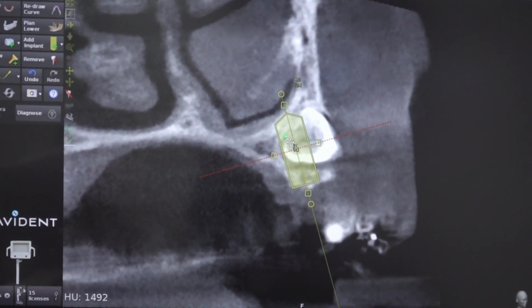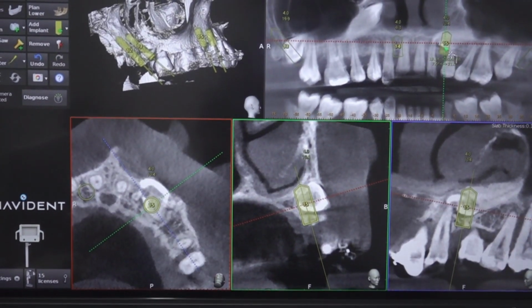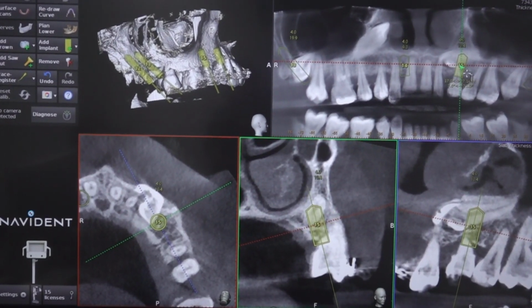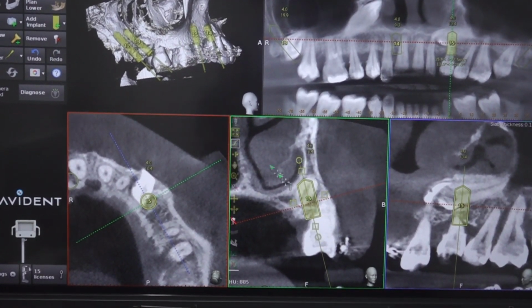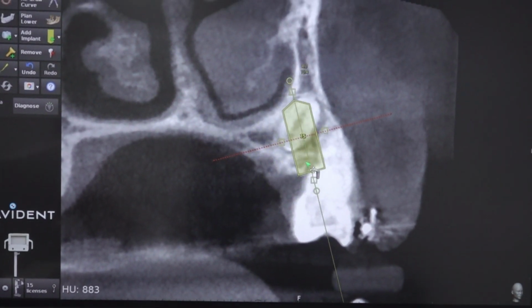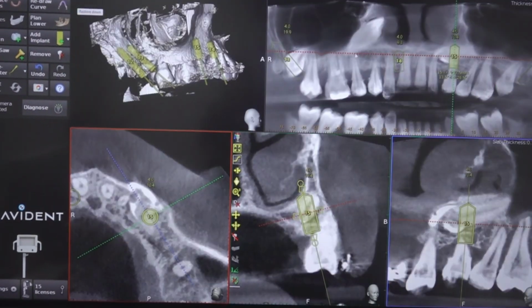Not an ideal scenario. So we are checking in the first premolar. First premolar somewhat okay. It is also bad, because crestally only 2 mm bone is there. After that the socket will come. After that only nasal floor, 1 mm after, will come.